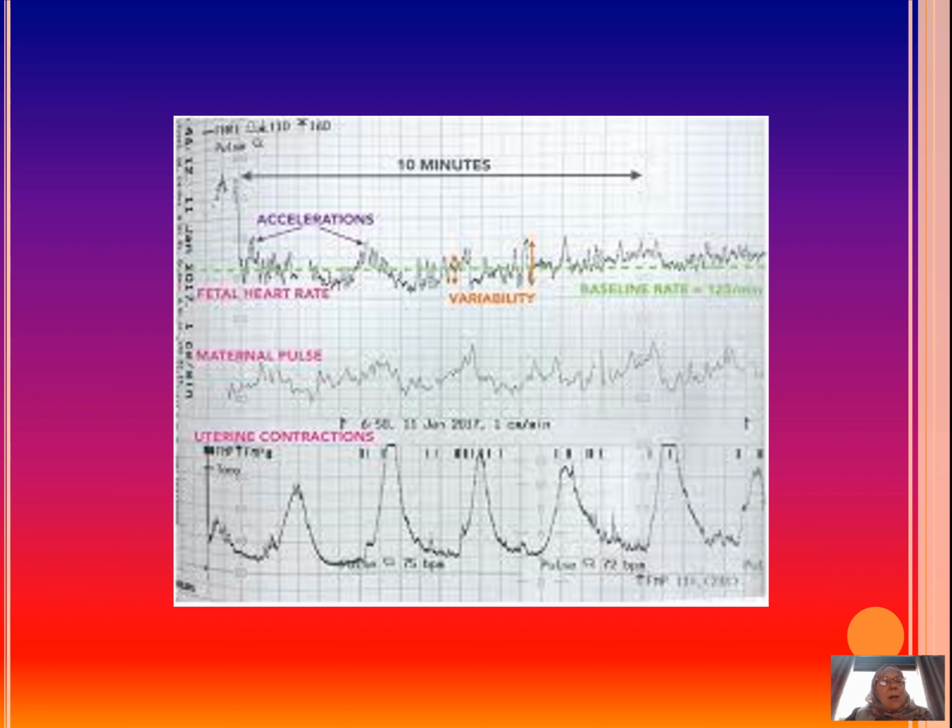So in a normal labor, you should have 3 to 4 contractions in 10 minutes. And this you can count easily on a CTG when you know what represents 10 minutes. Usually, and you can see this here as well, there's a number of rows of lines of numbers on the CTG that represent 10 minutes. So every 10 minutes you get some numbers on the CTG at the contraction part.